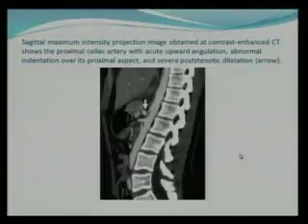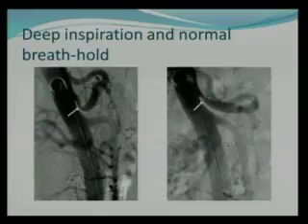Like Dr. D will tell you, in the past, when we didn't have very fancy ways of measuring the pressure gradient across a stenosis, if there was post-stenotic dilatation in a vessel, that usually meant that the stenosis was hemodynamically significant. If there was post-stenotic dilatation, which there is here, this is the normal caliber of the celiac axis, this is the area of compression, and this is the post-stenotic dilatation. So this is that V-shaped or hook-like angulation.